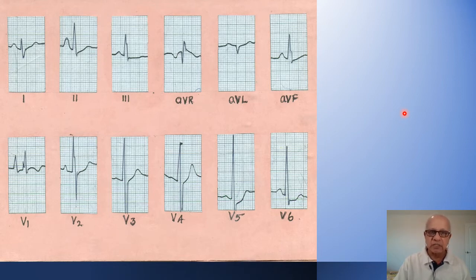Or in other words, the child has developed an Eisenmenger syndrome secondary to a large ventricular septal defect with a left to right shunt, isn't it? Of course, this child had cyanosis and clubbing of the fingers and the investigations later on.